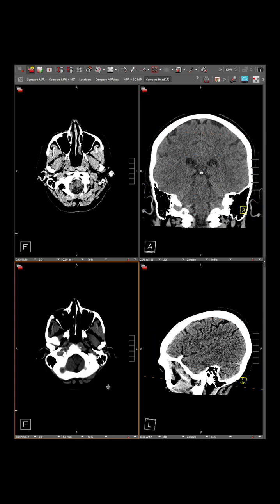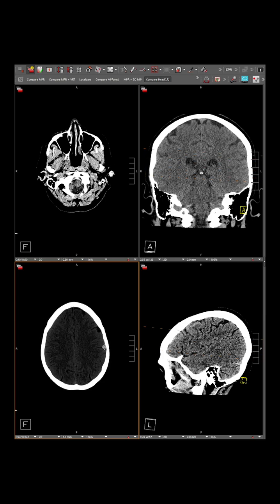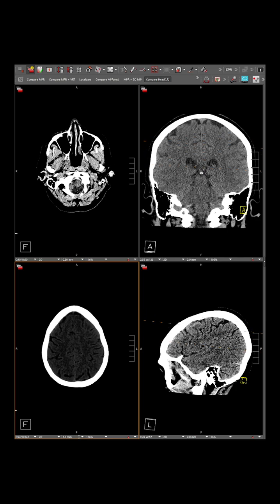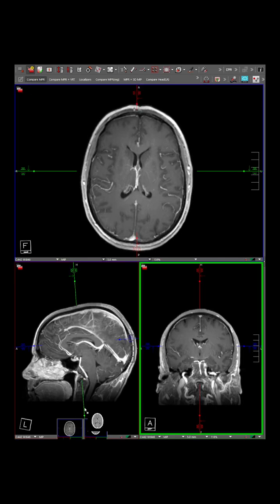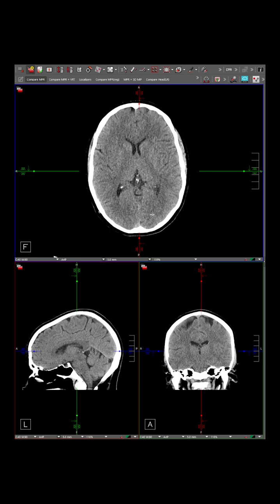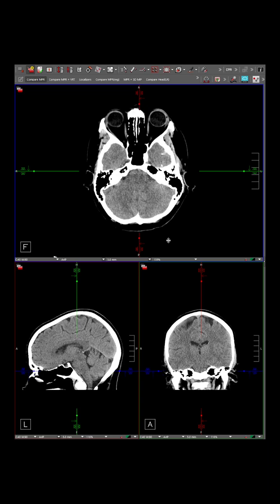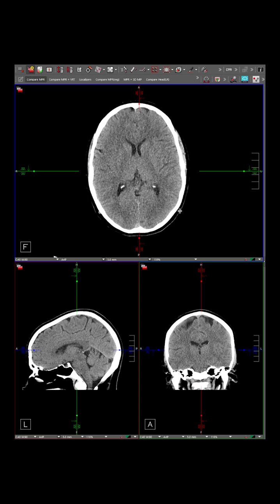So each image draws from differing 5mm sections of underlying data. But when you're in an MPR viewer, let's go back to this, and you've got 5mm slices, you can scroll smoothly so that each image draws from a set of underlying data that overlaps with the prior.